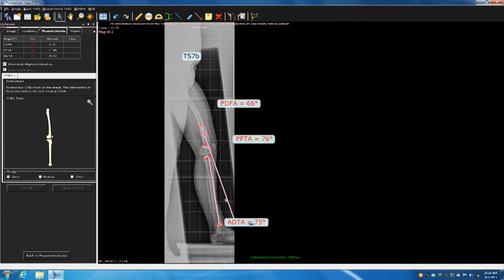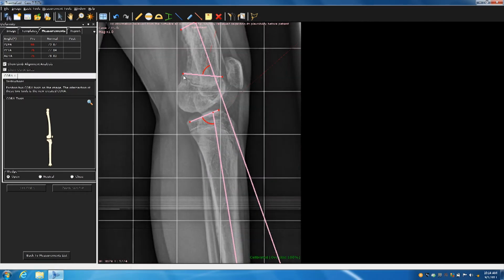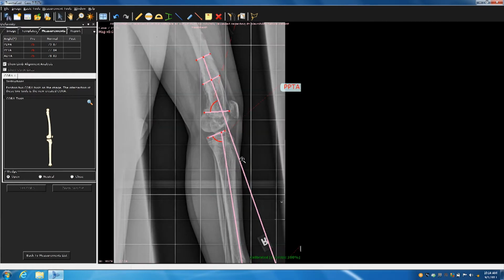And so you get your analysis and you see a bunch of red numbers. Again, zoom in and make sure you like your line. And it won't be the first time or the last time that I've taken an x-ray like this and then gone back to the x-ray room and did it again, right? So that's not a failure either. But let's just run with what we have.